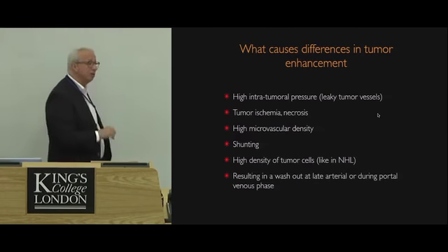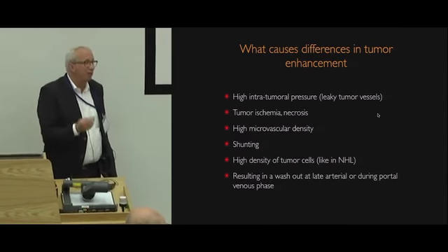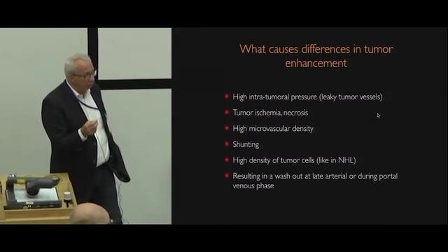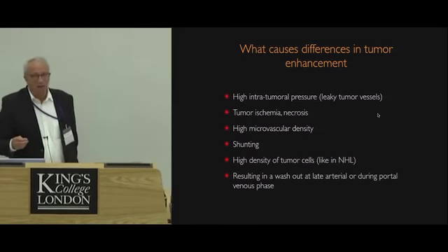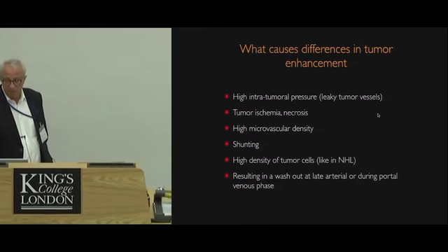Of course, as you just heard from David, we don't have these sinusoids in malignant tumors. That is, of course, correct. But also in hemangiomas, we have no sinusoids, and they also do not wash out. So we have to look very carefully at the vasculature of tumors.